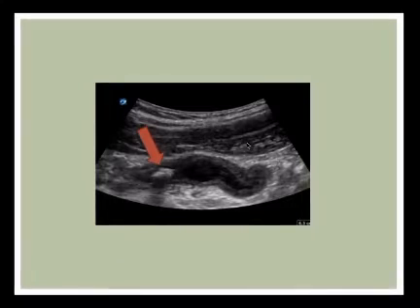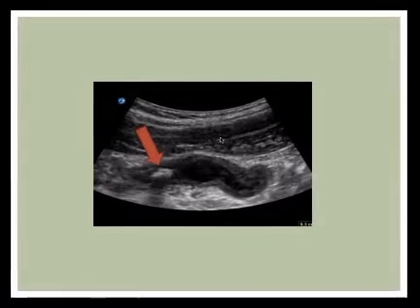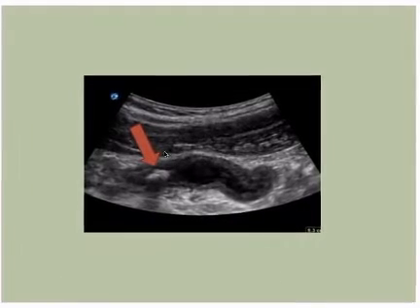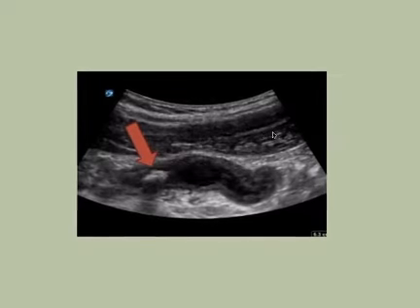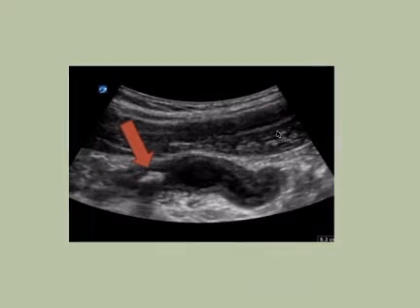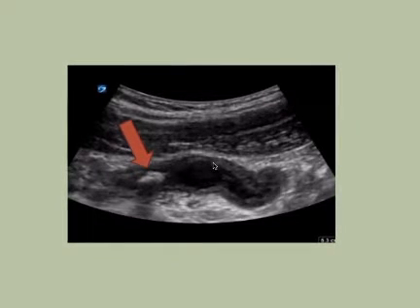On this ultrasound examination, we have the rectus muscle just below the layers of the skin, and here you can clearly see, arrowed, an appendicolith with posterior acoustic shadowing. The appendiceal wall is clearly thickened. In most texts, it's claimed that from outer wall to outer wall should be no thicker than 6 millimeters, and this clearly exceeds that. This is an undoubted case of acute appendicitis with wall thickening, luminal fluid, and appendicolith.